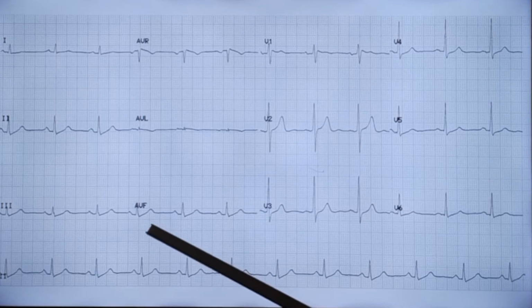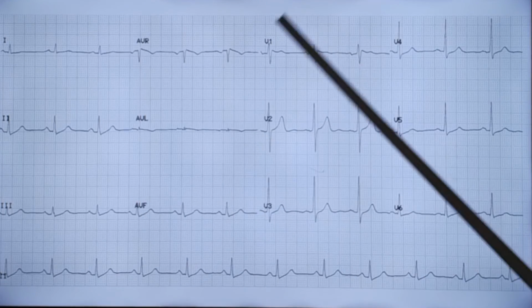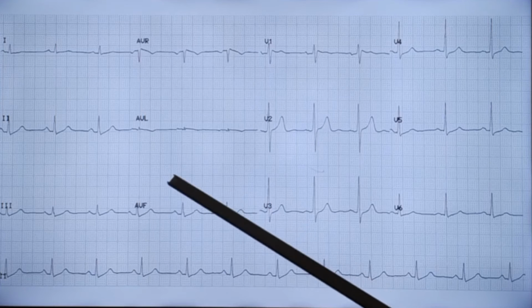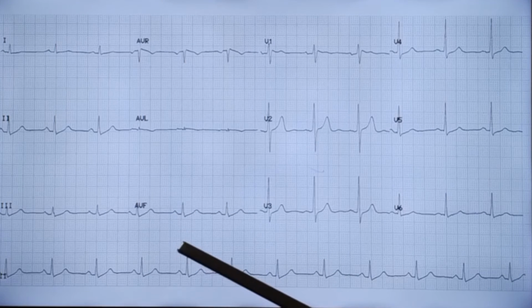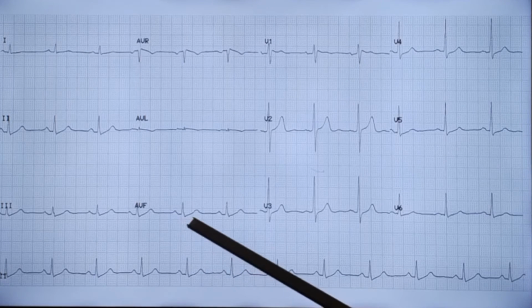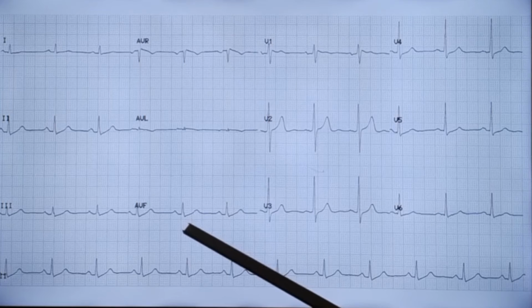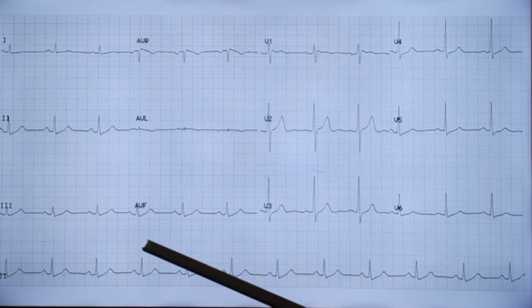And after the QRS, you look at the QRS patterns, whether there is an abnormal pattern, which will be either RSR pattern or QR pattern. Such patterns can be looked at. If there is a pathological Q wave, an initial Q wave which is more than 25% of the ensuing R wave and a width of at least 40 milliseconds, then it is called a pathological Q wave.